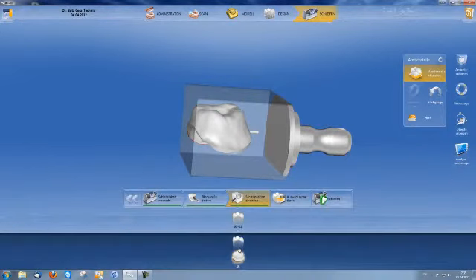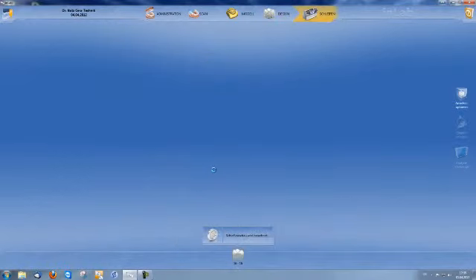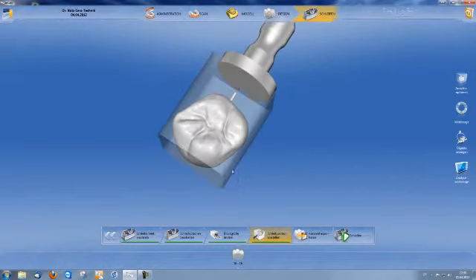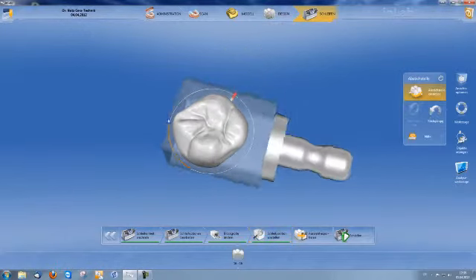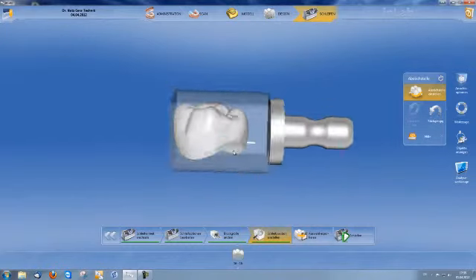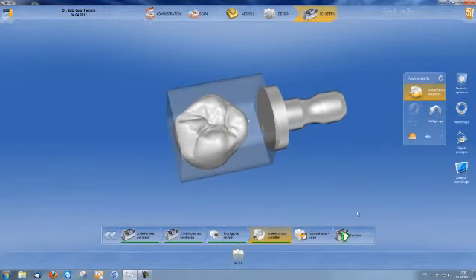During sintering, I have the opportunity to mill my veneer ceramic in lithium disilicate. The same applies here. Position the sprue location if required. In this case, I would not place it on the proximal surface in order to retain my contacts. I then activate milling.